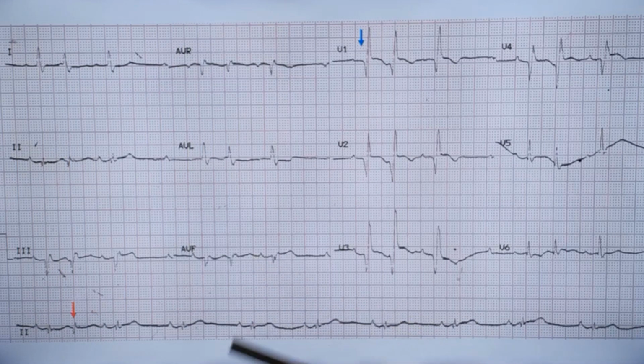In this ECG, this would not interfere with our interpretation, but sometimes when there is fine atrial fibrillation, you might miss it if you have such a broad baseline here. Now, coming on to the regular sequential analysis of this ECG, first you look at the rate of the ECG. You can see that the RR interval is about 30 millimeters. So the rate would be around 50 per minute.